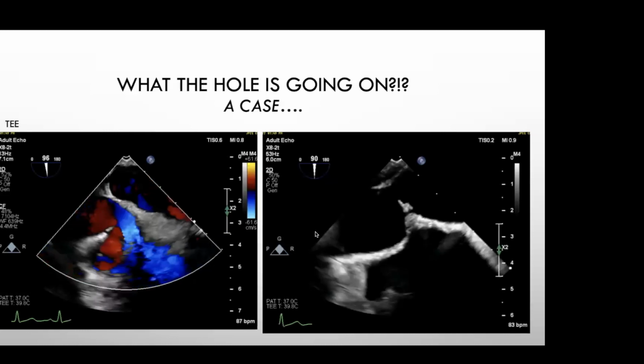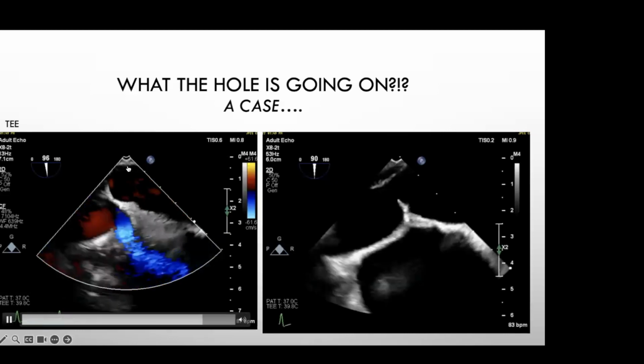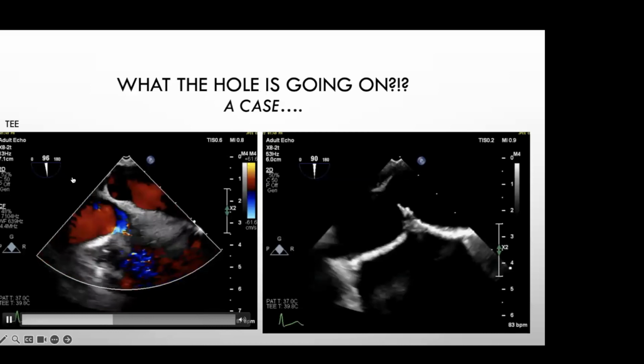So I'll just kind of walk through these pictures. The first image shows the left atrium on top, and then we see the IVC.